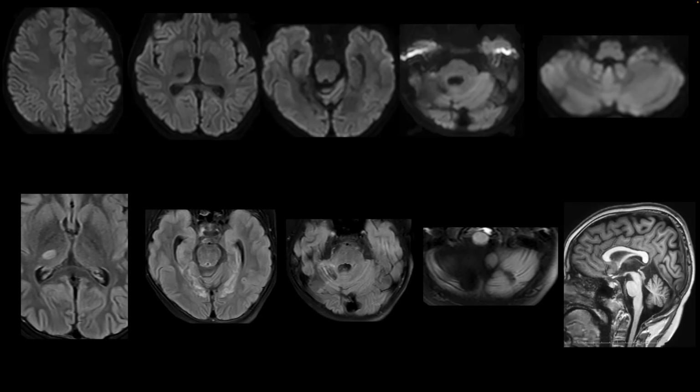So a follow-up scan was done after 4 months, the December 22 scan, and after which a follow-up scan was done on 3rd of March 23. The follow-up scan showed no acute changes, no new lesions, but the abnormalities in the previous scan demonstrate gliosis and some areas of encephalomalacia. And craniovertebral junction, I could not appreciate any abnormality. To raise a possibility of Bow Hunter syndrome, given the recurrent strokes.